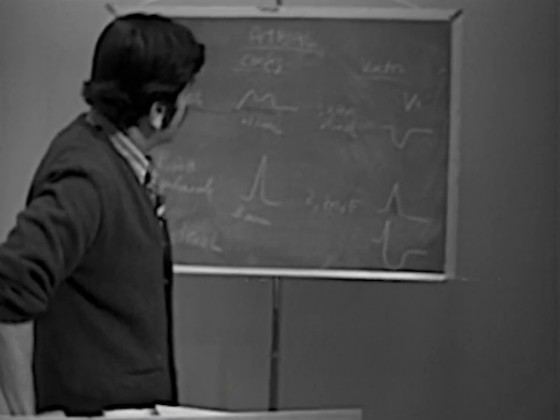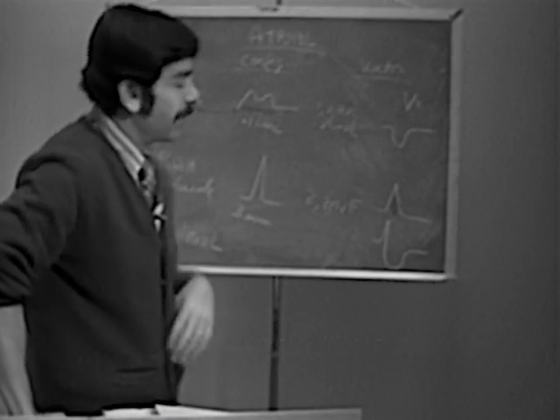Okay, now on many patients we see some conflicting data. For instance, we see a broad notched P wave, but we're surprised because it's best seen in leads 2, 3, and AVF. Or another thing that you see, for instance, is you see peaked P waves, but it's best seen in 1 and AVL. So there seems to be a discrepancy.